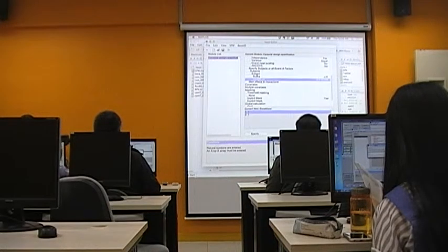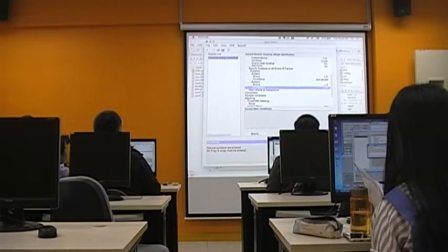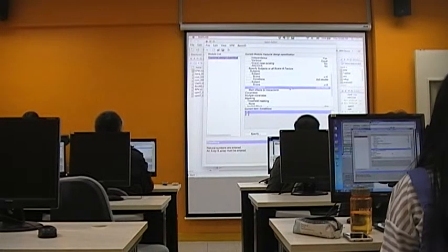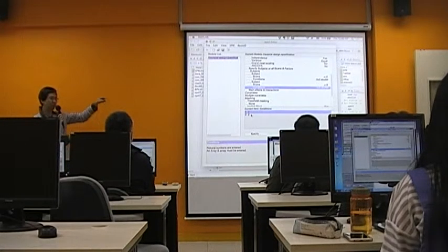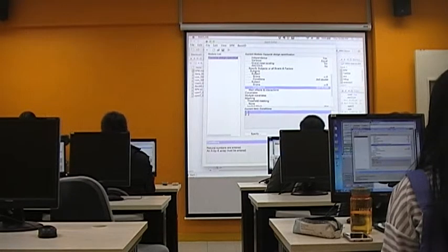I don't put any scans here, I just want to demonstrate. Let's say I have a second subject, so you choose the scans in the conditions. Now you put 1, 2, 2, 2, because the first image is the one back for the second subject, and the second image is the two back for the second subject. It will become clearer if I add the first subject.